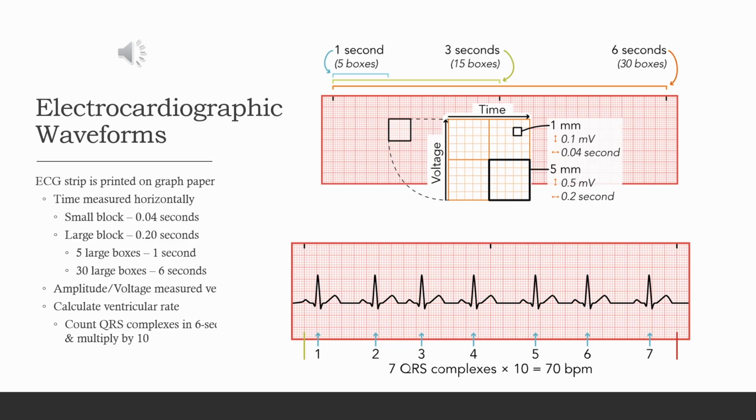The time in between each tick mark represents 3 seconds. On the bottom slide there's a total of 3 tick marks. Between the first one and the second one is 3 seconds, and between the second and the third one is 6 seconds in total.